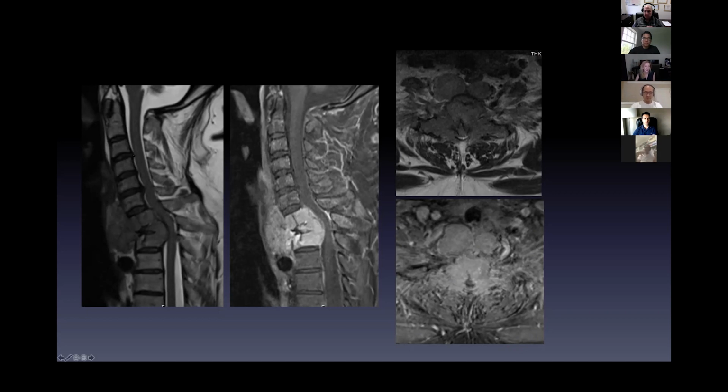So yeah, like you said, it's a sagittal T2 here and a sagittal post-contrast fat-saturated image. I'm just going to say a little bit about the imaging for those of you who don't know a lot about the details of the MRI. A lot of you do, but when we do these post-contrast fat-saturated images, we do them because normal bone marrow is almost entirely fat, and fat is bright on T1, so sometimes it's hard to see the enhancement with the normal marrow signal. So we take out all the fat signal, so the enhancement is very avid. So that's just a little radiology pearl for that.